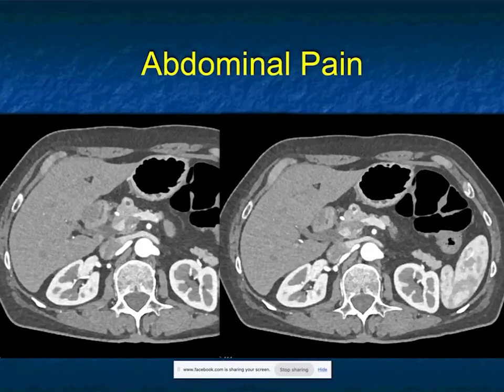Another patient, abdominal pain. There's a lesion, a really small lesion, about a centimeter, in the head of the pancreas with enhancement.